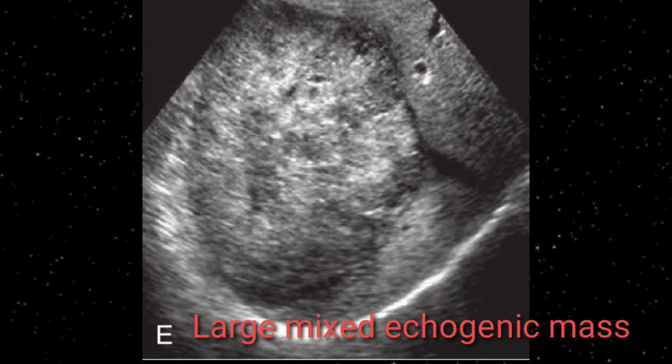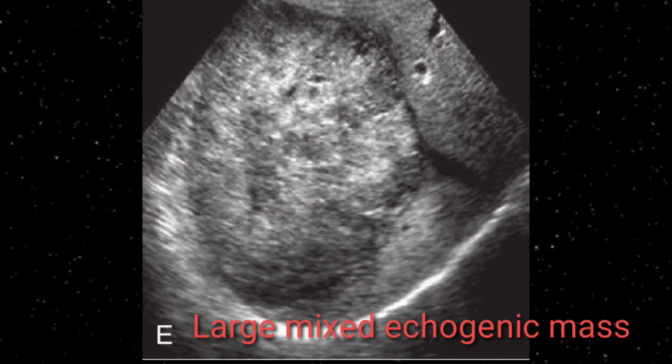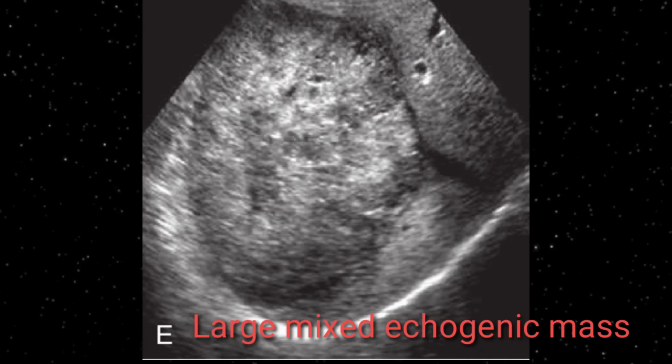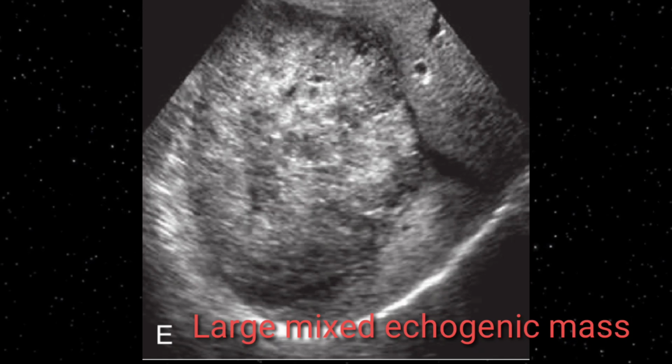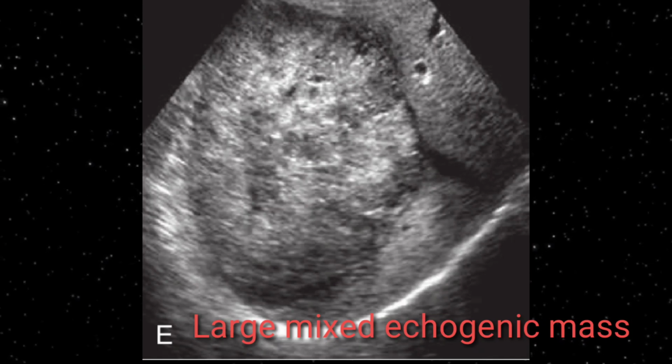In the background, liver parenchyma is mildly coarse. However, you can see that the margins of the liver are smooth. This is the best example of solitary mass type hepatocellular carcinoma.